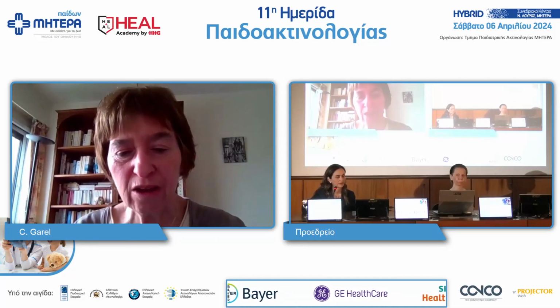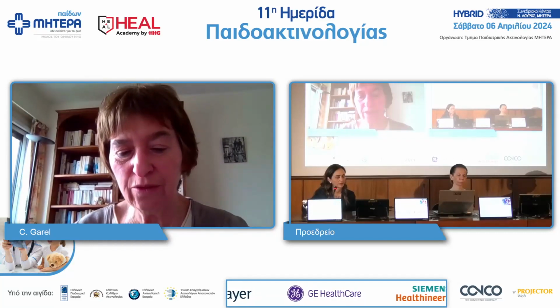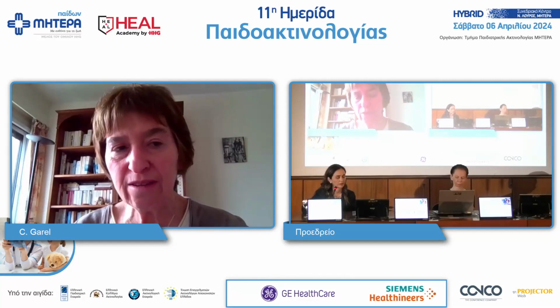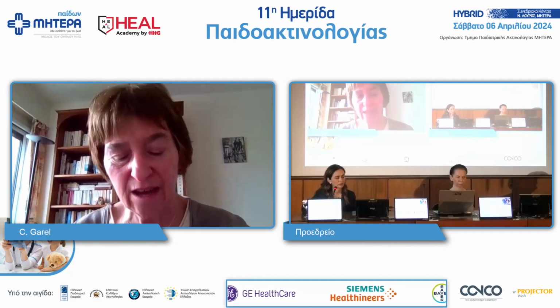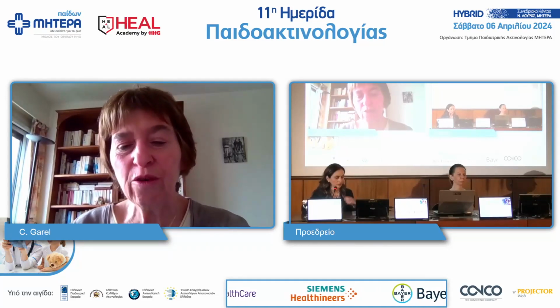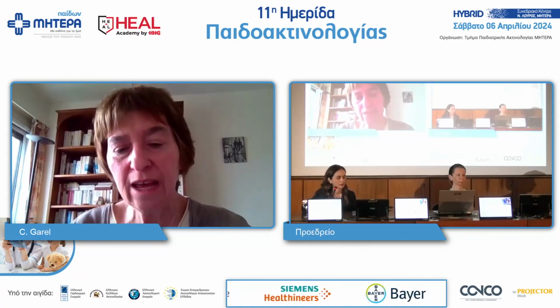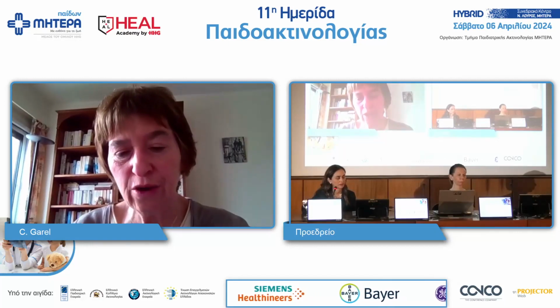It can help a lot. As it is an evolving process, you've seen that I've shown examples with a normal TCD, a transverse cerebellar diameter, initially at 22 weeks of gestation, and then it is smaller a month later. So we don't hesitate to perform another MR scan a month later if we cannot answer the question on the first scan.